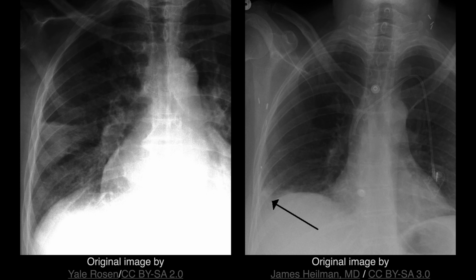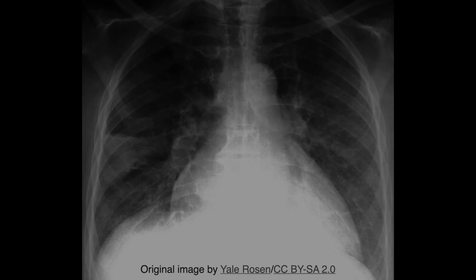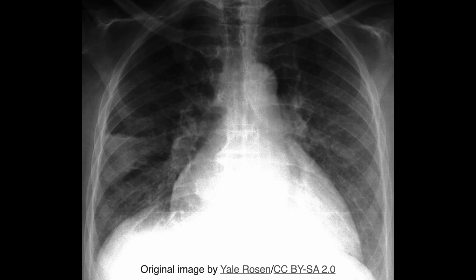The plain radiograph of a patient with a pulmonary infarction can be deceivingly normal, without any striking abnormality identifiable. In this X-ray, we can see a sign that is known as Hampton's hump. The wedge-shaped opacity in the periphery of the lung is a rare but suggestive finding of pulmonary infarction. The base is juxtaposed to the pleural surface, while the rounded apex, that is the hump, is angled towards the hilum.